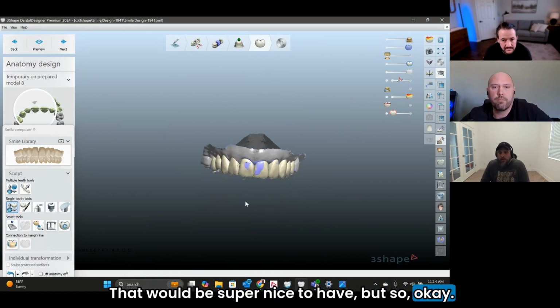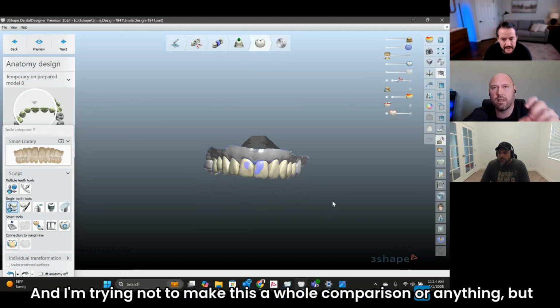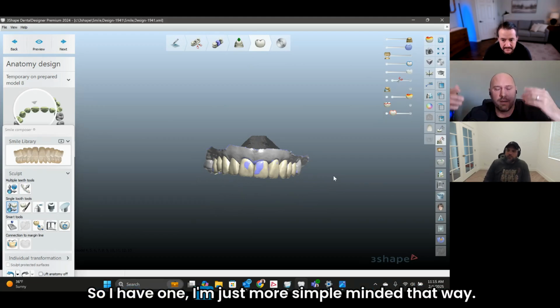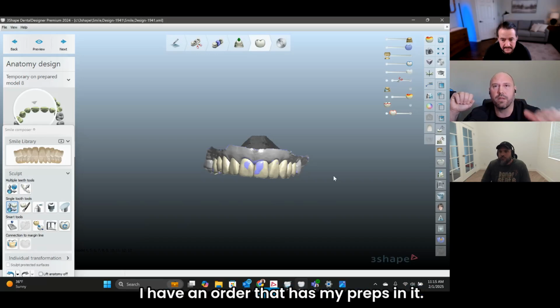Okay. In a sense, I like that. And I'm trying not to make this a whole comparison or anything, but I do kind of like having everything within here. You know what I mean? I'm just more simple-minded that way. Like I have an order that has my wax up. I have an order that has my preps in it.